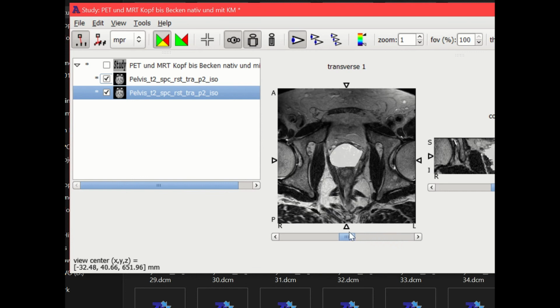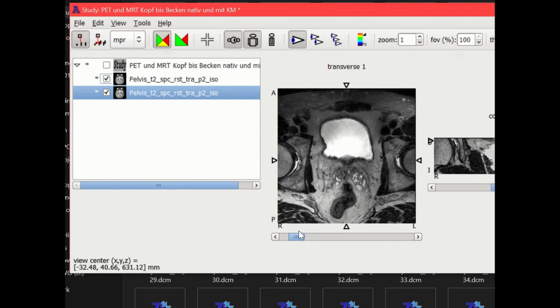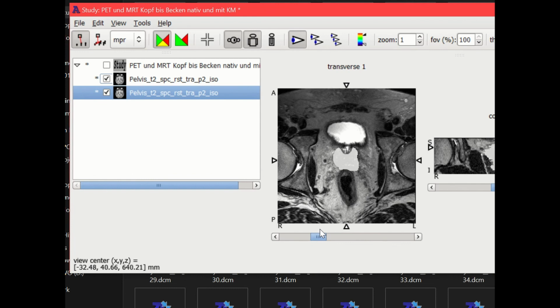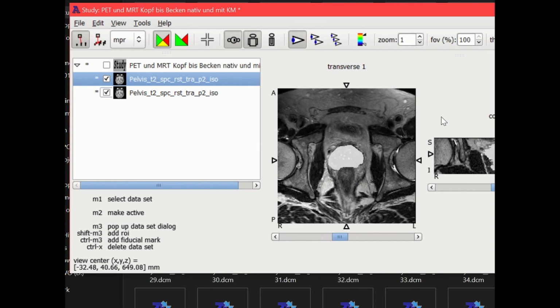So sometimes the segmentation could just go on forever, but in this case, the segmentation even understood how to segment when there is no prostate. The segmentation is quite good, so we can say that this was a success. Remember that we basically already had a trained network, and we only added one extra epoch, so in total we have 41 epochs, and that's why this is a good segmentation. Normally, with the first epoch, you wouldn't get such good results.